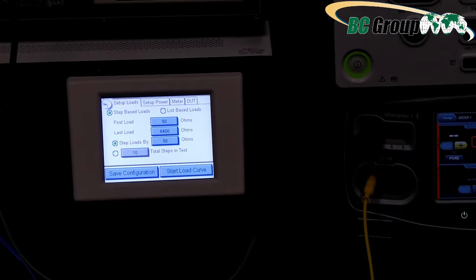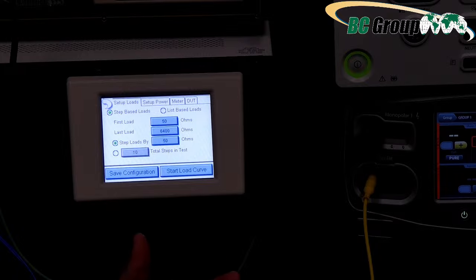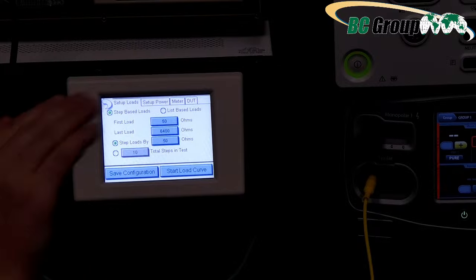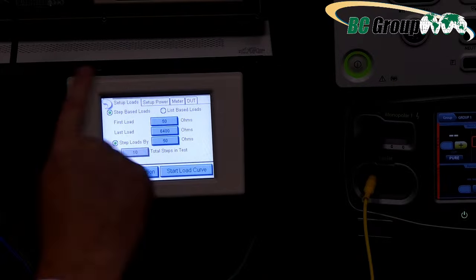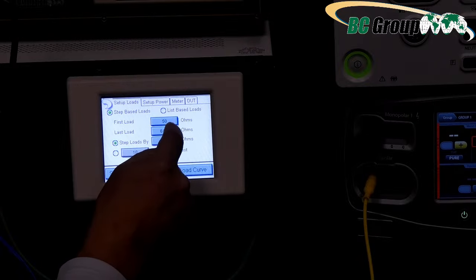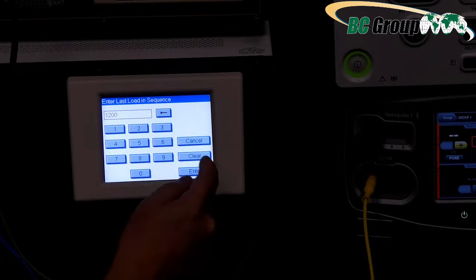Okay, here we go. So I'm setting up my test, and a lot of your ESUs will tell you the normal range for their load curve. In fact, the old ones like the Force 2 and the Force FX, Force FXC, etc., including the Bovie brands, a lot of the old manuals had an actual chart that showed the curve that you're supposed to experience. So I normally start at 50 ohms. Let's say we end at 1200 ohms.